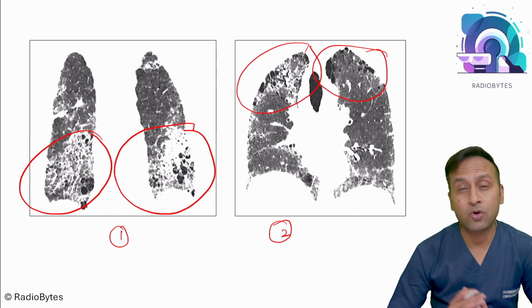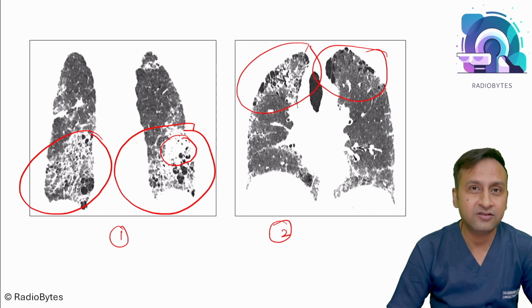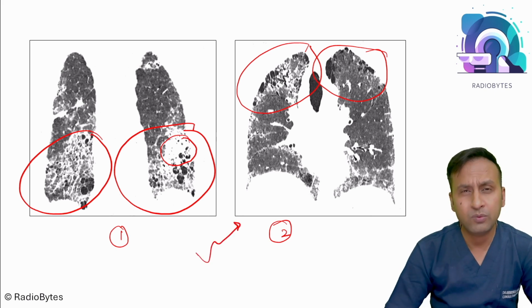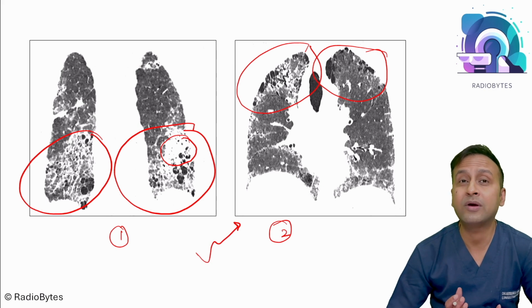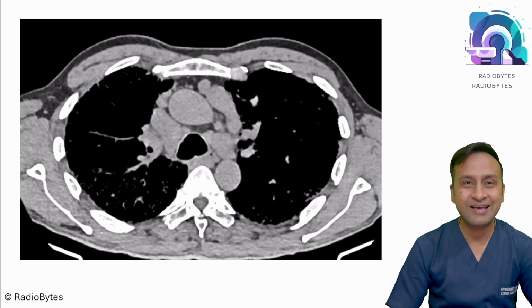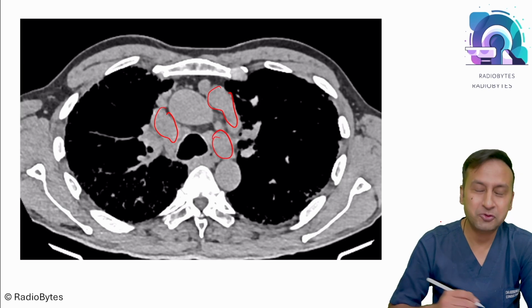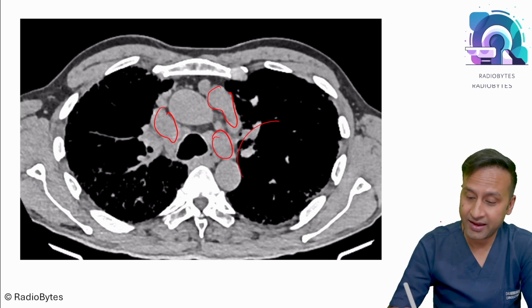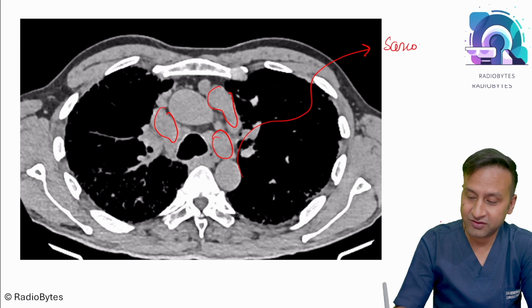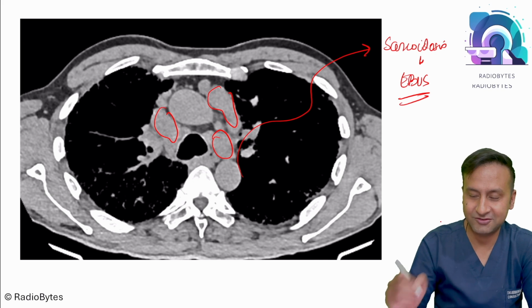And in this case, we can also explain the fever because the fever was caused due to a superadded infection resulting in consolidation and cavitation. So the final answer to be given is, if this is not UIP, what is it? Many a time we cannot tell what it exactly is, but there was a clue hidden in this case, and the clue was the soft tissue window. We could see all these plump lymph nodes scattered throughout the mediastinum, and this is the reason why we gave a presumptive diagnosis of sarcoidosis, which was confirmed on endobronchial ultrasound.